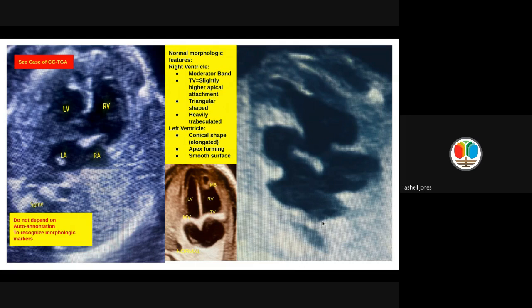We see pulmonary veins and atriums, we see the descending aorta, and then you see how this chamber looks. Like, oh, that doesn't look like a typical right chamber. That's what caused him to explore more, and truly he did see that that is the moderator band. It was confirmed by the cardiologist that the ventricles were switched.